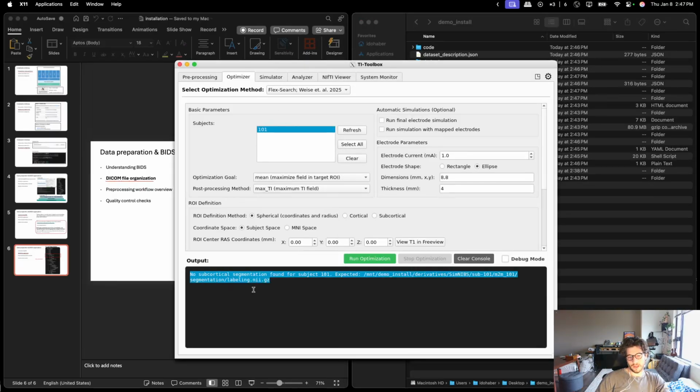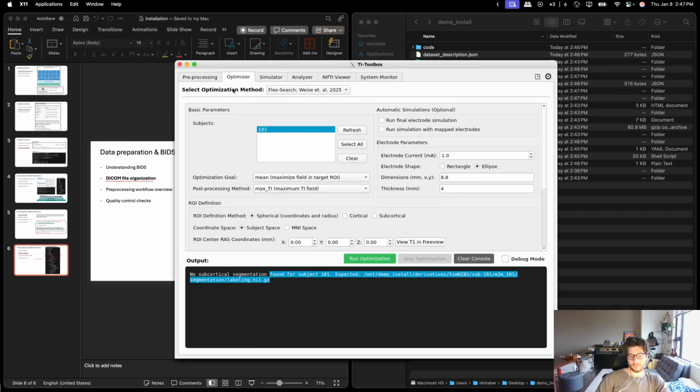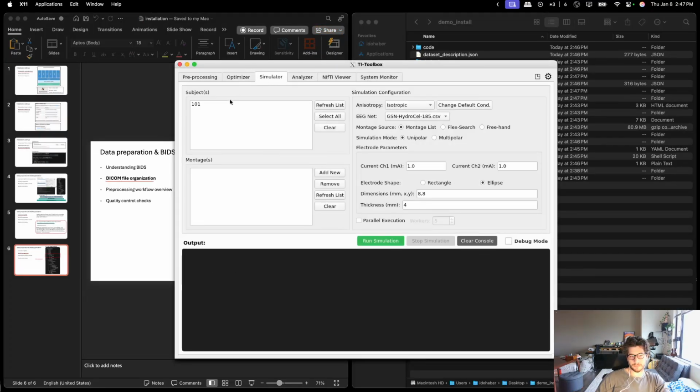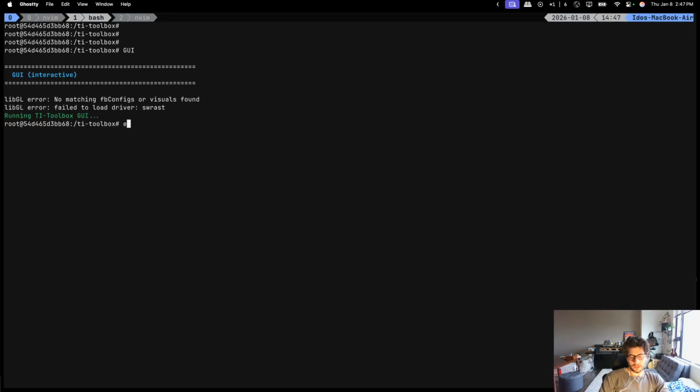But as you see, because the operation did not complete, it's screaming at you saying, no, I'm not ready, please finish the operation. Okay. Now, let's exit.